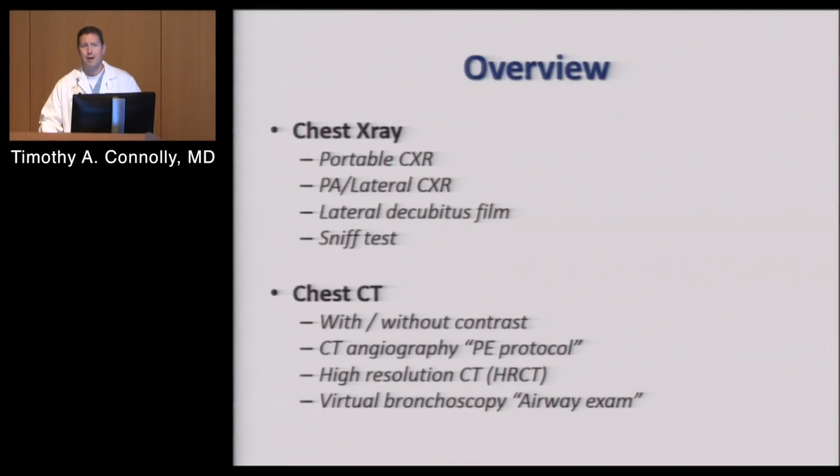Unlike some of the talks that you may have heard or may hear later, this is not going to be something that is very overly scientific. This is going to be very clinically oriented. And the problem is chest radiology encompasses so many different diseases, so many different modalities, that in order for you to really get a good feel for it, rather than me sitting up here and scrolling through one CT, we're going to really do kind of an art history overview and just fly through a ton of images so that you can hopefully get a good exposure, at least, to some of the terms that are thrown around: bronchiectasis, ground glass opacities, et cetera.